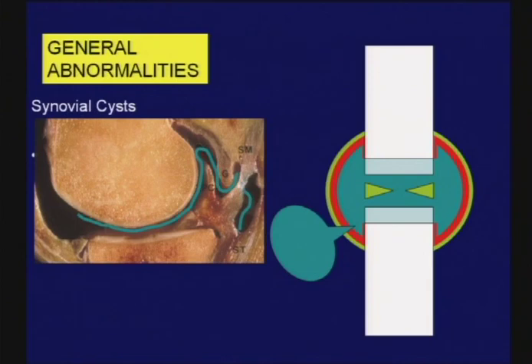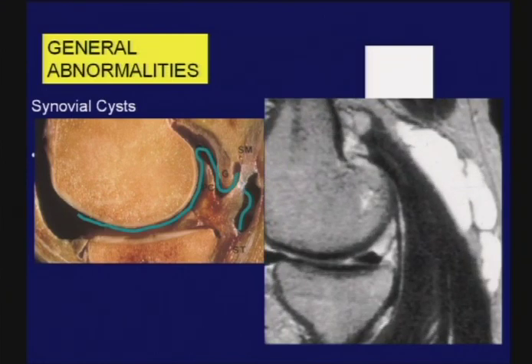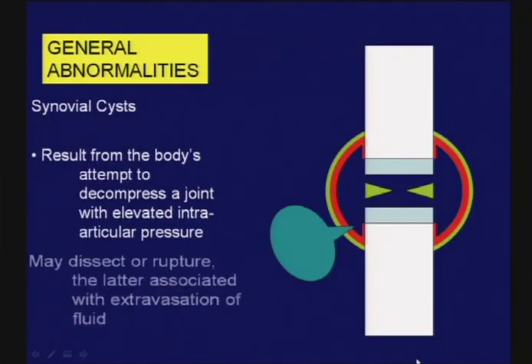The popliteal cyst is a manifestation usually of something wrong in the joint. So you have to address what is in the joint that's producing this particular cyst. Large cysts, the most common cause is rheumatoid arthritis. Small cysts, the most common cause is an internal derangement of the knee. MR imaging, of course, provides excellent delineation of these cysts. Here's a classic lobulated one on a fluid-sensitive sequence.